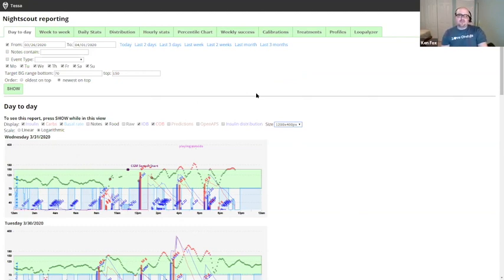If you actually want help, I imagine most of you aren't asking for help from your endo if you're looping. So if you just want to give them some information and train them a little bit, I like the day-to-day report.